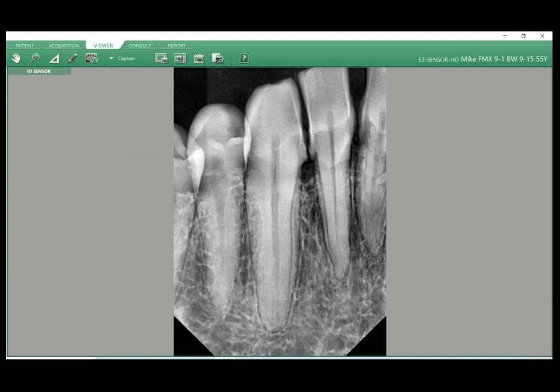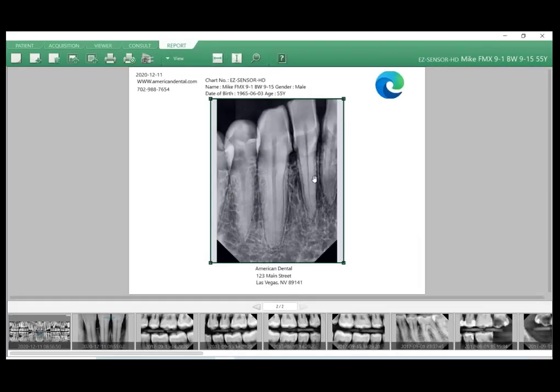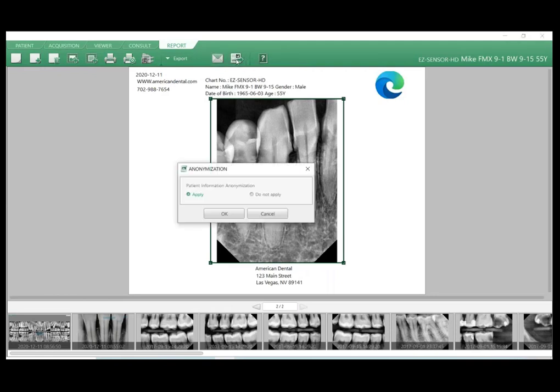So again, the report here, which is really handy, if you don't see it, is under capture, and then click this icon here, and then bam, whatever you have on that viewer screen, it brings that up, and then click that button. It automatically transfers that to this report, which I could then do the drop down and go to export to email, which Jim's going to talk about, and then also exporting this right from here.